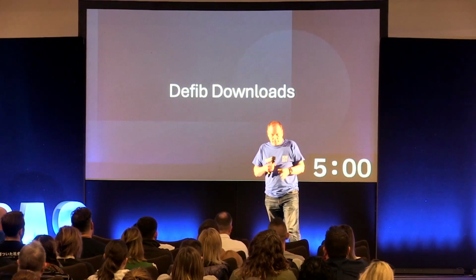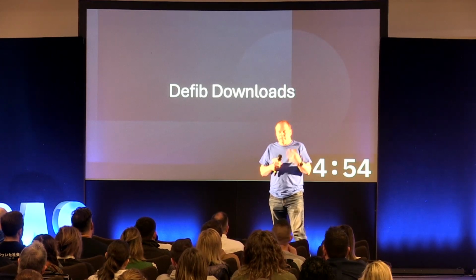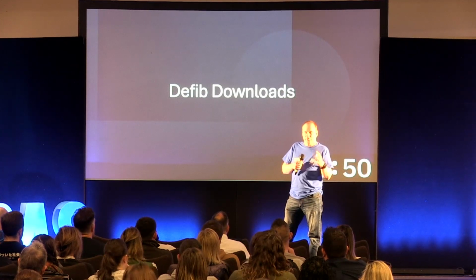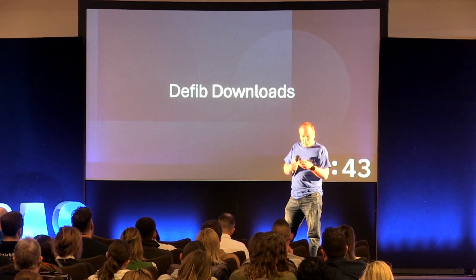So I'm just going to give a quick rundown on some of the things that we're doing in the cardiac arrest team, looking at defib downloads. Every time we go to any event and we switch on our machine, whether it be for monitoring a patient or in a cardiac arrest situation, when you upload all the information, this is what I'm going to be talking about.